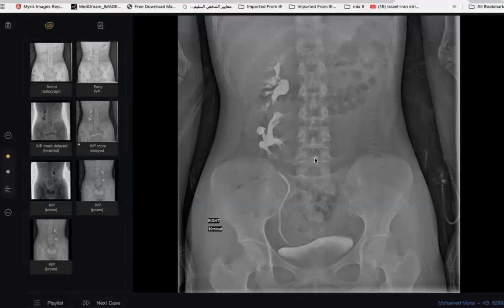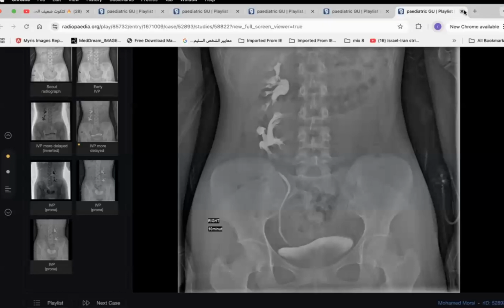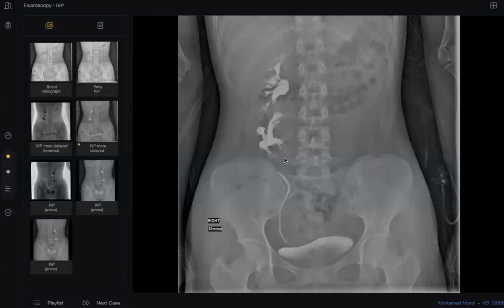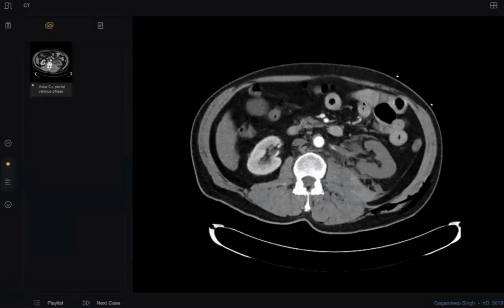This patient, if he has a trauma here, he will be unlucky. Both kidneys may be damaged. This is one of the most bad drawbacks of crossed fused ectopia. And sure, it may also predispose to infection, multiple infections. Yes, thank you, doctor. Next candidate.